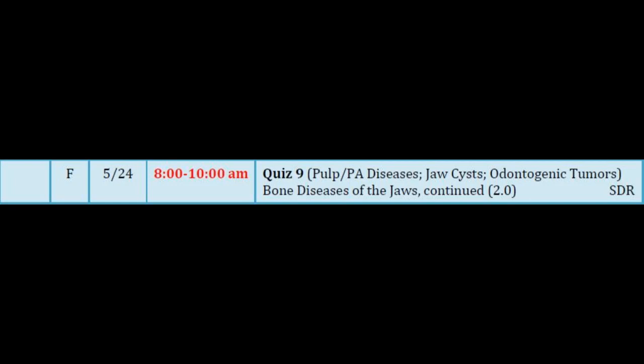Border reaction. What do you see? It's corticated, but I don't see a distinct radiolucent rim on this one. And the teeth are superimposed on it. But I like this case because when you look at the density of that mixed lesion, what does it most closely match for our normal structures? Is it the same density as the enamel or the dentin of the teeth? No. It's almost identical density to the normal bone in the mandible.